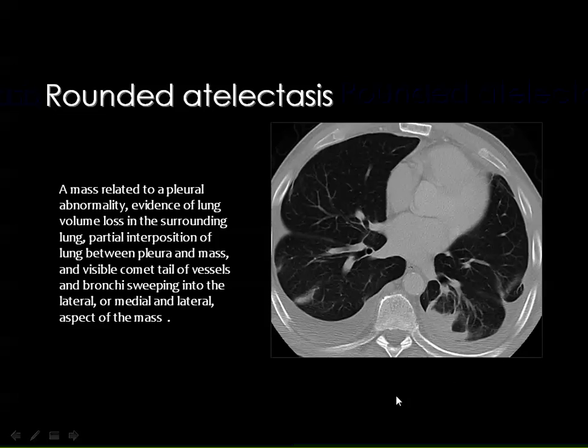You remember that I have said if you have a peripheral pulmonary nodule with a speculated outer margin, you may suspect peripheral bronchogenic carcinoma, and anyone may feel that this is the speculated margin of a lesion. But whenever you see that these lines correspond to the vessels and the bronchus, and you have a localized pleural thickening adjacent to the lesion, and also you can see some air bronchogram inside the lesion, all these are conclusions for the possibility of round atelectasis, together of course with the appreciable loss of volume in this particular area.